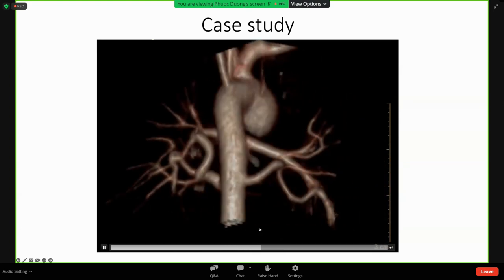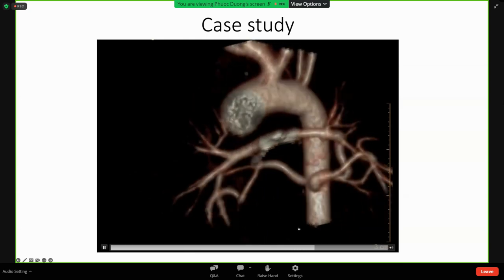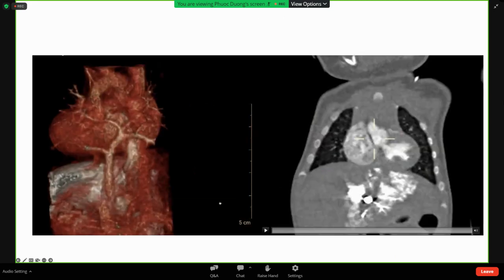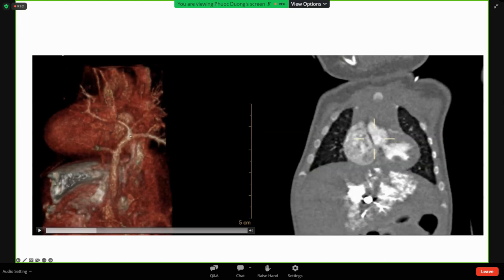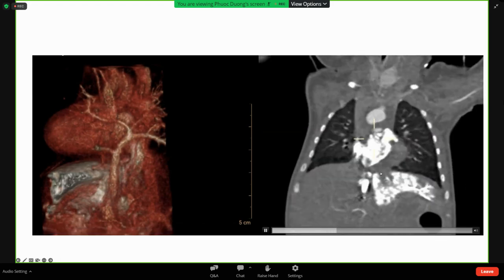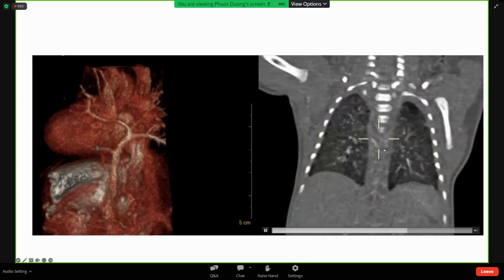We said potentially we could bridge this patient towards becoming a bigger size, and then plan to do some further reconstruction. However, on the echo we also found an additional diagnosis of TAPVD, and with the value of CT we can see the anatomy of the infracardiac TAPVD, all these pulmonary veins joined together and coming to this confluence. But going back to the point I highlighted previously, you can see the relationship between the pulmonary vein confluence and where the MAPCAs are, really close to one another.